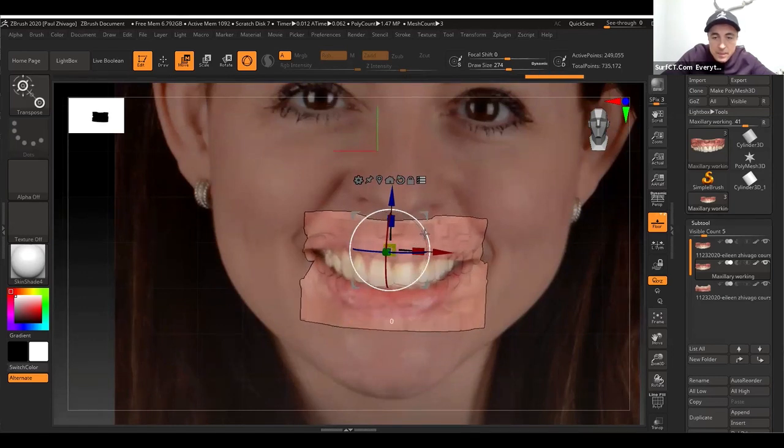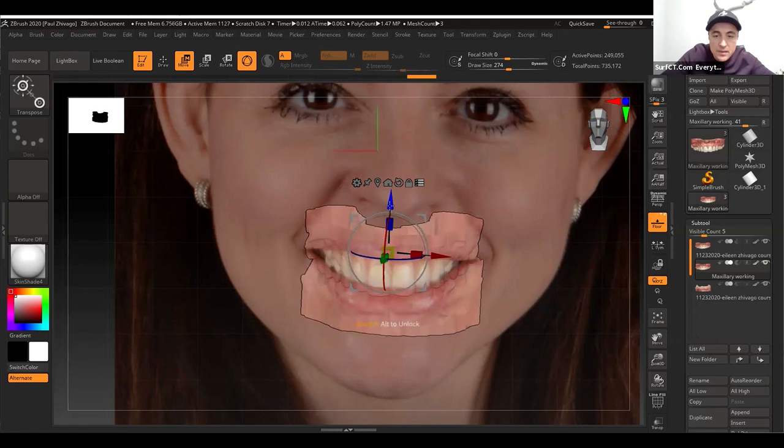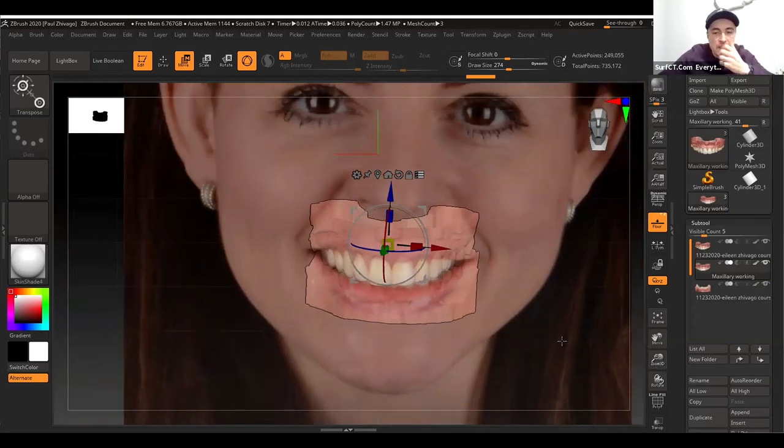Here we go. I believe that this comes very close to overlapping. We want to align them a little bit. Like this, maybe. This part can be a little bit tricky, but I think now we're pretty accurate in terms of how it's aligned.